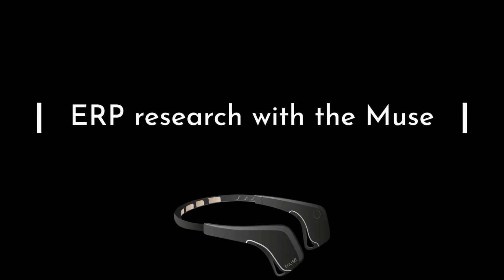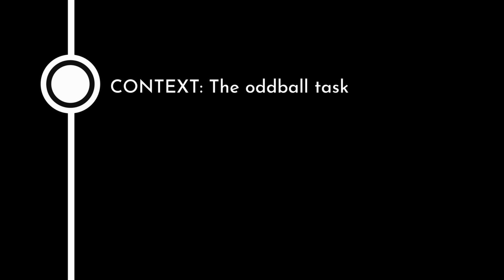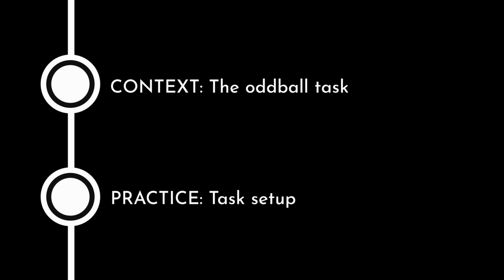Hello, welcome to another video in the series of tutorials dedicated to using the Muse headband in ERP research. This video is meant as a brief guide to setting up experimental tasks using the Muse-compatible peer software currently available on iPadOS. We'll start with a little bit of context by looking at a commonly used experimental paradigm known as the oddball task. And after that, based on a simple example, we'll go over the specifics of creating and customizing an oddball task using the peer app.